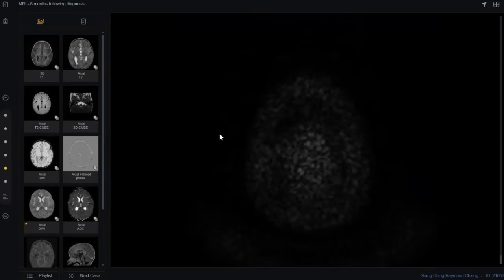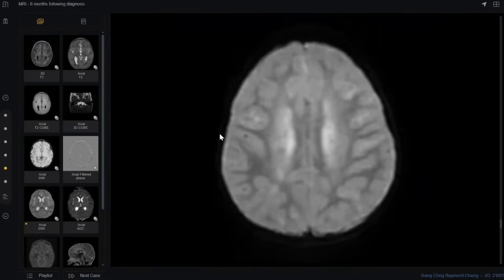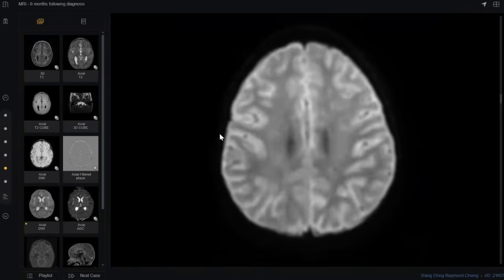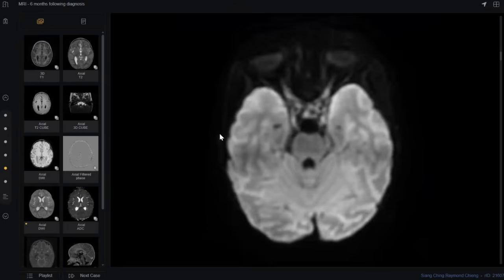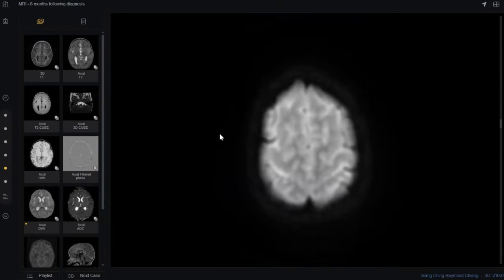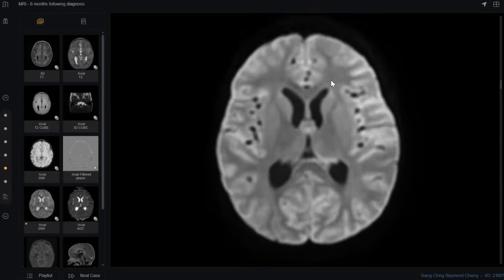I have been presented with the MRI brain, axial section, of the same patient. To make a gentleman's agreement, the examiner only has this sequence, and you should comment on it. Okay? Don't look at the left list. This is the only available sequence. Go on. Can you scroll for me again? What is the name of this sequence?